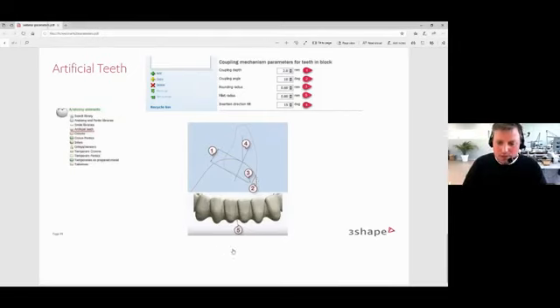Let me see, there were a few more questions. When you were marking the gingiva and the papillas, to pull them up and down, you showed us one side for teeth. But you can also mark all the gingiva at once, I assume. If you like, you can just press the Alt button and press it on all the papillas on the denture.